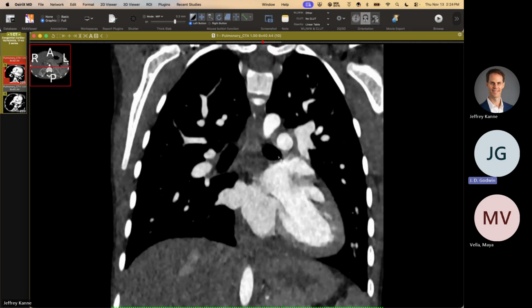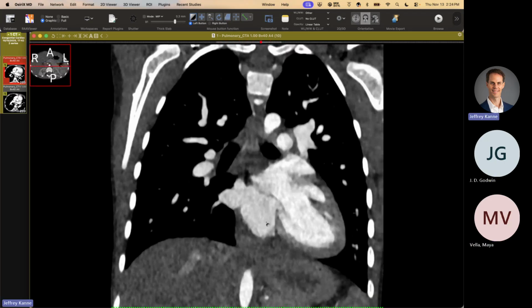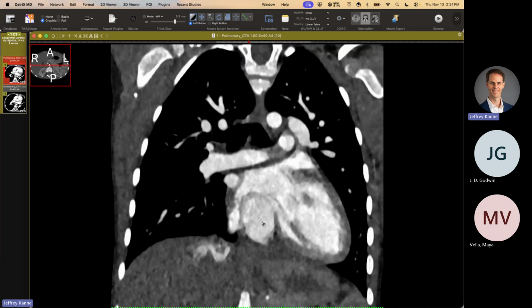About an inch in there. Yeah, and it really just comes into the coronary sinus. It's not a very long one because it's just the lower veins. But yeah, you can see there's the right vein and the left vein coming in down here into this vertical vein right here, and this connects right up into the atrium.